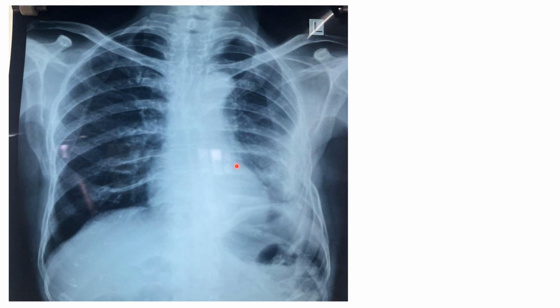This X-ray, just see grossly, on the left side there is a volume loss. Compare the rib spaces, this right rib space, compare it with the left. The left is narrowed. It's quite obvious, and the diaphragm is also slightly pulled up, and there is a diffuse thickening here. It is pleural fibrosis or pleural thickening. Because of that, this area is contracted, so the hemithorax is also contracted.